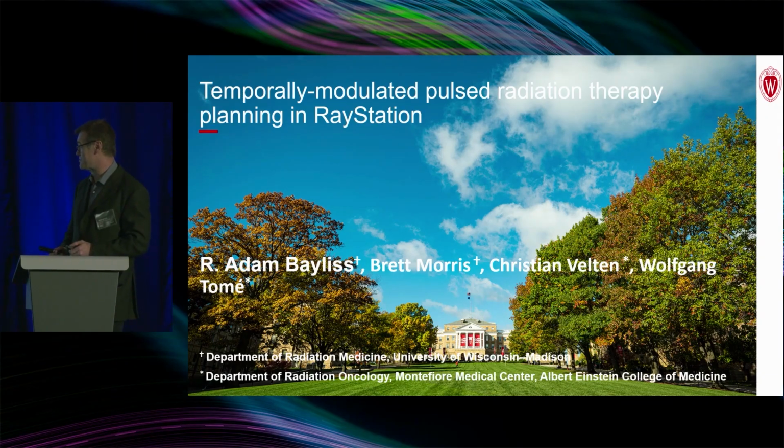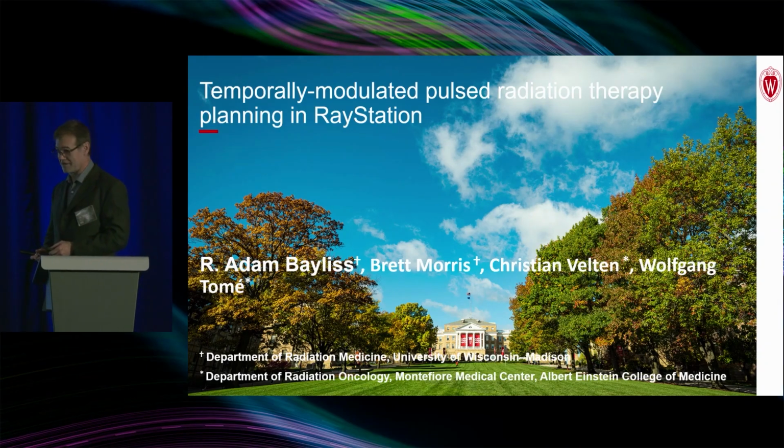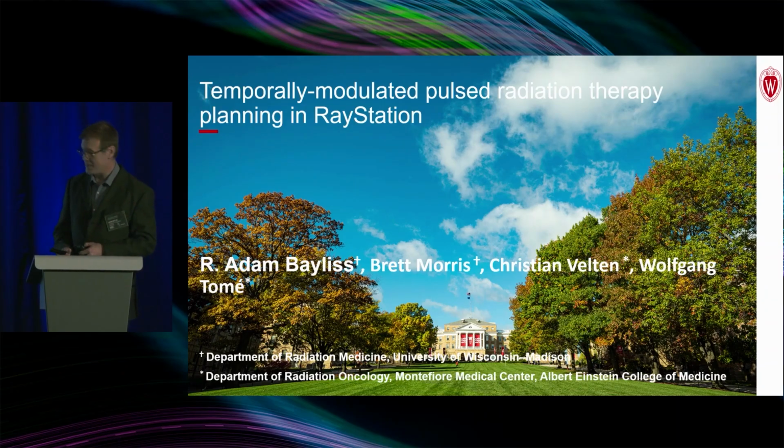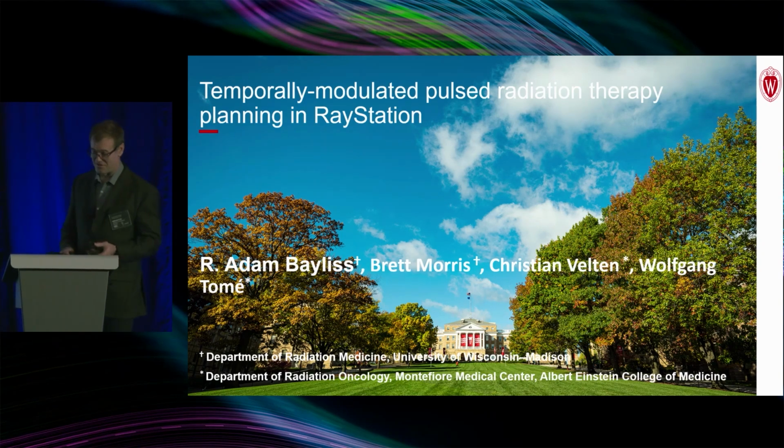I'm going to be talking about temporally modulated pulsed radiotherapy planning in RayStation, which has the distinction of being kind of inverse FLASH. I know FLASH is really exciting these days, but if FLASH is as fast a radiation as you can deliver, this is more like soft white or sepia or something like that. It's as slow as you can deliver the radiation.